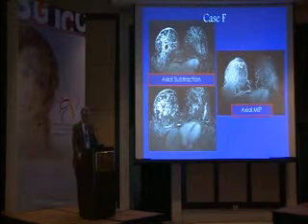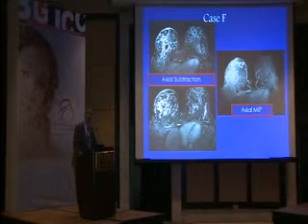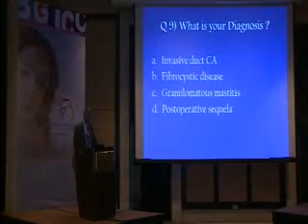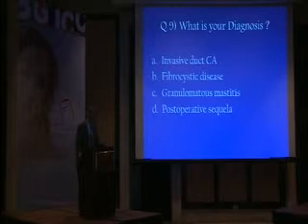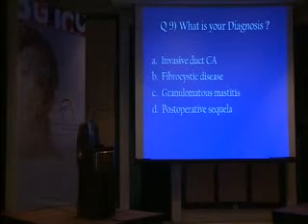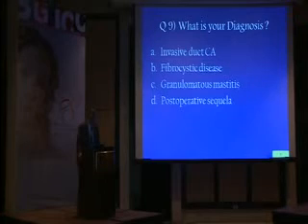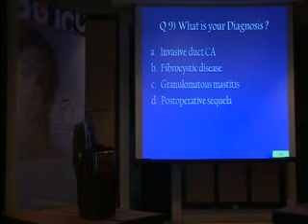I'm sure some of you have clinched the diagnosis, but don't be that confident. So, what's your diagnosis? Is it an invasive duct carcinoma, fibrocystic disease, granulomatous mastitis, or, don't forget, she's had an operation before, a post-operative sequela?